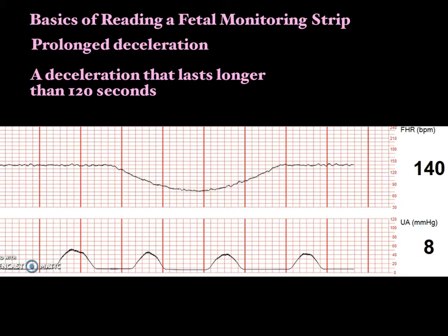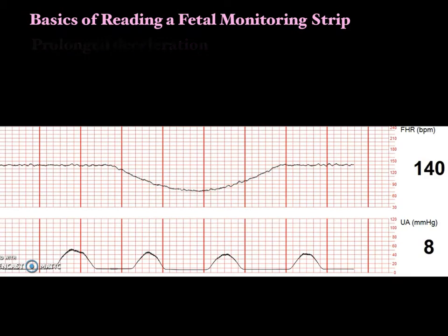Now, if a deceleration lasts longer than 120 seconds, it's still a deceleration, but if it lasts longer than 10 minutes, it is now a change in baseline. It is now called fetal bradycardia. And if you have that pattern, that's certainly something. It's persisted long enough that now you're calling it a bradycardia.